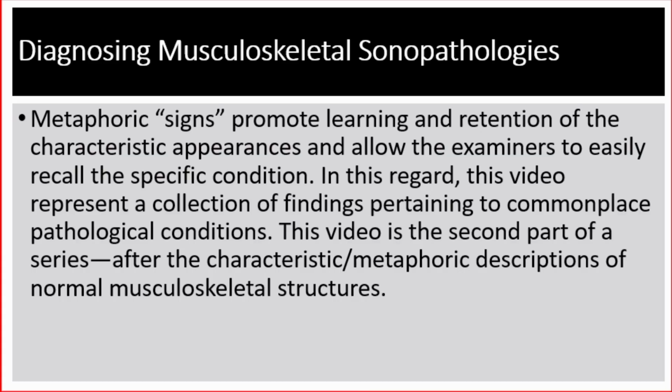As you know, metaphoric signs promote learning and retention of the characteristic appearances and allow the examiners to easily recall the specific condition. In this regard, this video represents a collection of findings pertaining to commonplace pathological conditions. This video is the second part of a series after the characteristic metaphoric descriptions of normal musculoskeletal structures.